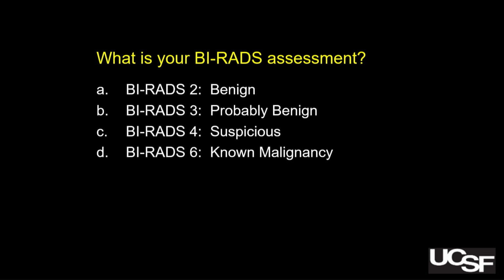So, BI-RADS assessment, as you all have learned, when there is something that rises above background, especially what looks like linear enhancement, it should be a BI-RADS 4 suspicious. So now this talk, when you all got comfortable with that concept, is to say also watch out for pitfalls. So apologies, but it's one of my pet peeves.